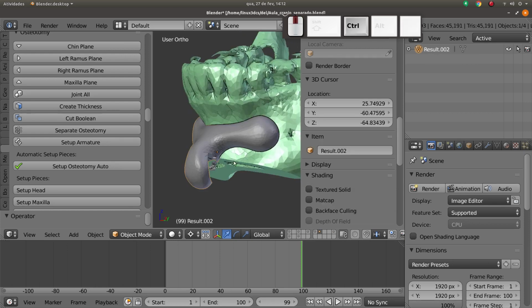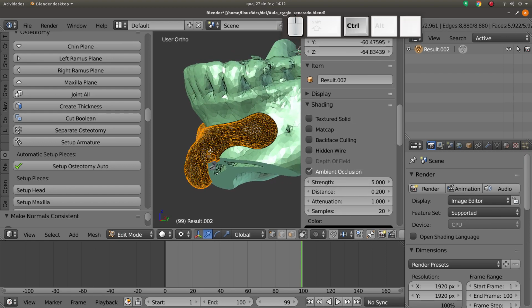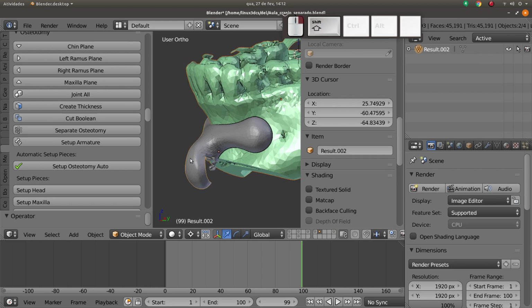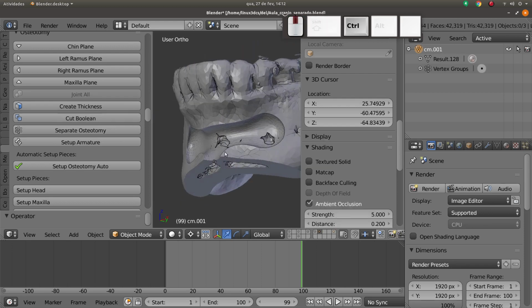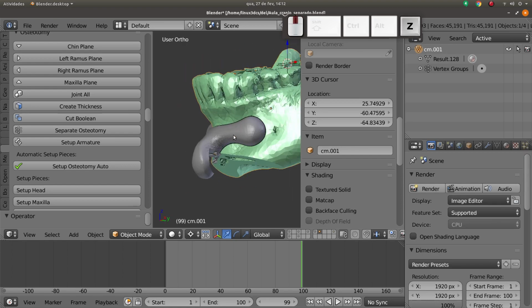I really don't know what's happened here. I'm doing all right. This less this. Oh. Okay, this less this. We have some problems. I don't know why.